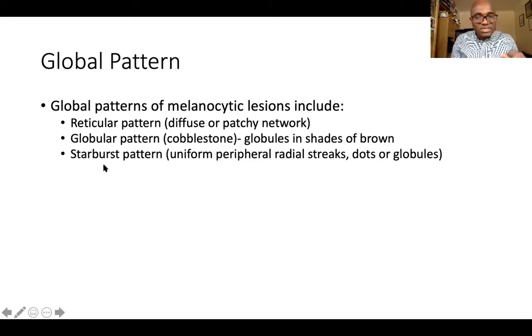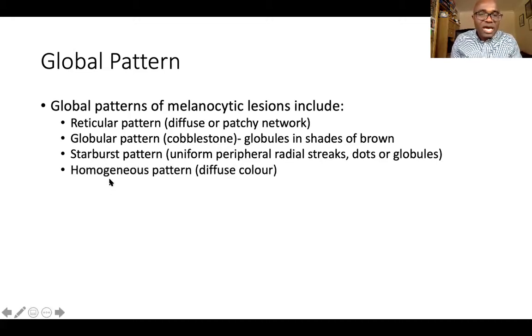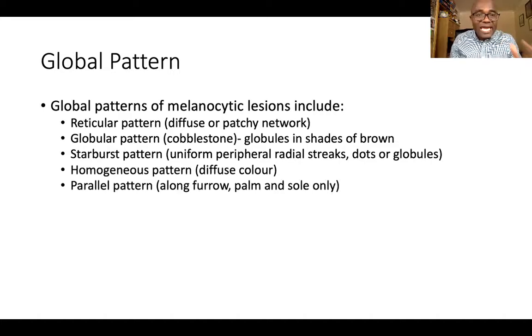starburst pattern, which is kind of specific for the Spitz nevus, as well as the homogeneous pattern, which could be for blue nevus. And then again the parallel pattern, which is found only on the palms and soles, and is characteristic of benign melanocytic lesions on the acral surfaces.